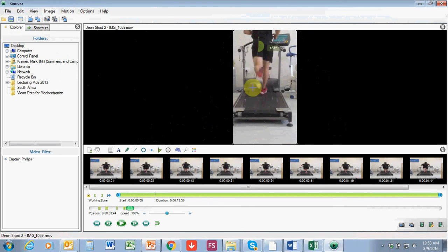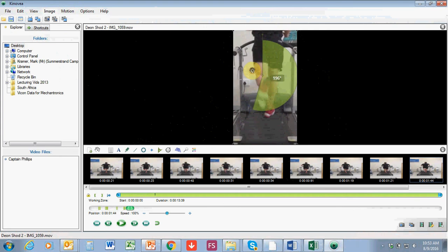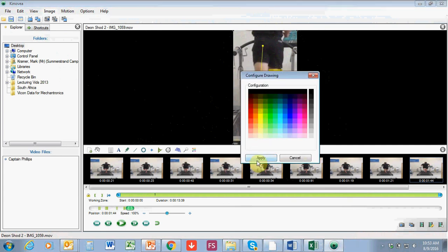So again, mid of the axis of rotation, you do mid knee. So just zoom in, move this up a little bit. Just want to make sure that we hit the middle of the knee. This movable arm goes middle of the calcaneus, and this one is middle of the glute. Alright, so you can see this is, let's just invert these colors, just make this yellow.